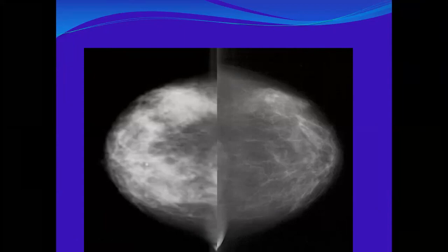You can, but if the compression is for the whole breast, the patient might not tolerate it, or maybe the breast is swollen, making more compression difficult. You might repeat, or look at the other view for associated distortion or microcalcification.